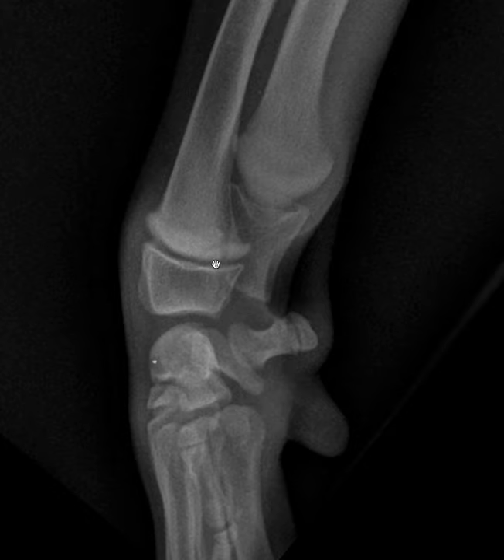Shape. I would like the physis to have a parallel shape when I look at the epiphyseal side and the metaphyseal side, okay? In the case of our distal ulna, we've talked about there's an anatomic feature here that the shape is actually a V shape, but you can see that the epiphysis and the metaphysis remain fairly parallel. So that's my size and shape. I also look at the opacity. The physis should be lucent, of course, because it's made of cartilage, and we know that cartilage has a soft tissue opacity.